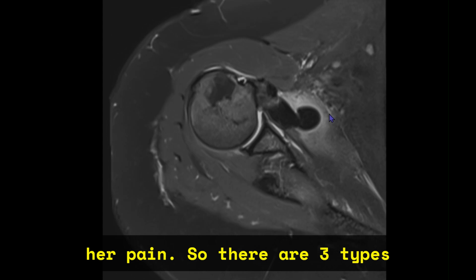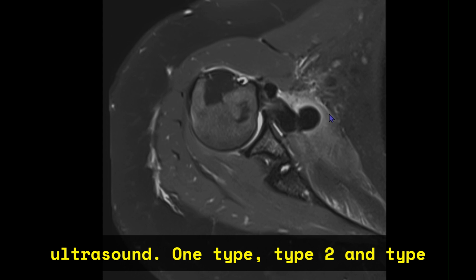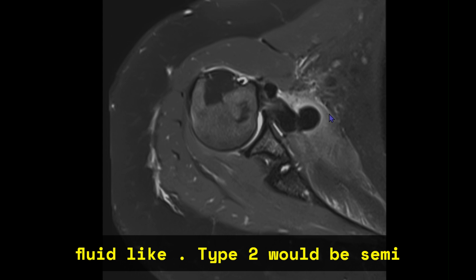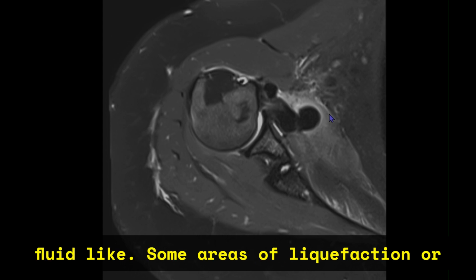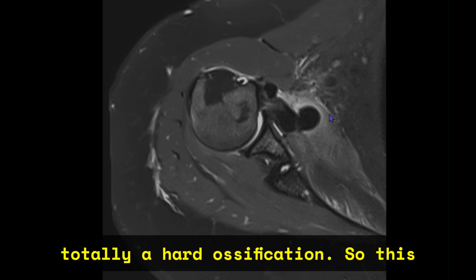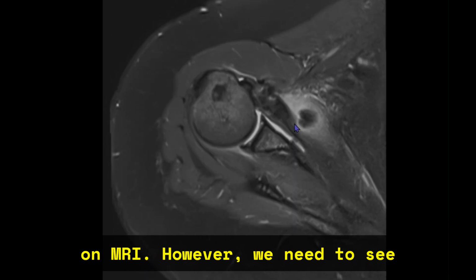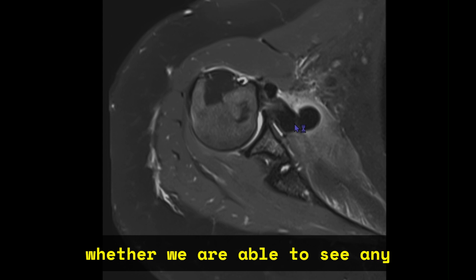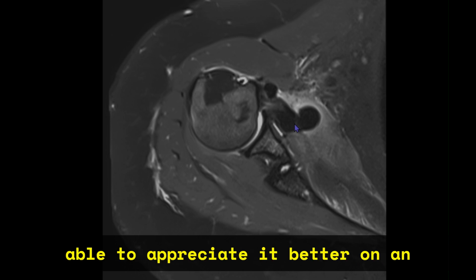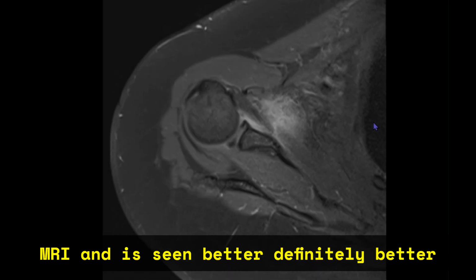So there are three types of calcification that we mention on ultrasound: type 1, type 2 and type 3. Type 1 is liquefied, almost fluid-like. Type 2 would be semi-fluid-like, some areas of liquefaction or softening are there, and type 3 is totally hard ossification. So this appears like a big chunk of ossification on MRI. However, we need to see whether we are able to see any softening within it. Sometimes we are not able to appreciate it well on an MRI and it is seen definitely better on ultrasound.